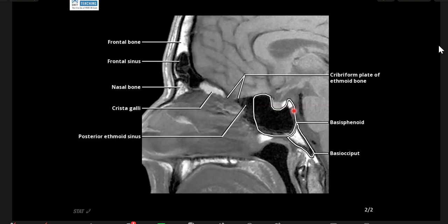So this is the pituitary gland, this is the clivus, and this is the sphenoid. So the sphenoid sits below the pituitary. Then comes the nasopharynx. Portion of it will be anterior to the clivus. But in our case, the epicenter was here. It was all filled up.